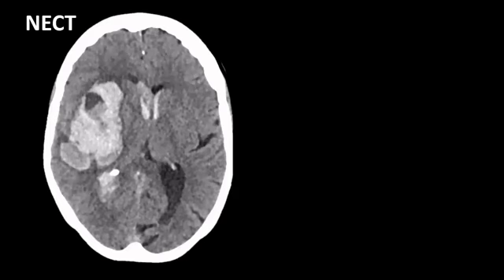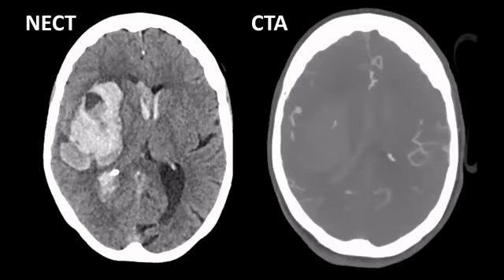Let's now talk about some signs associated with hemorrhages. And let's start with one you can frequently encounter, because it is my philosophy that every patient with a primary hemorrhage in the brain, so a non-traumatic brain hemorrhage, should receive a CT angiography to rule out underlying vascular malformations.